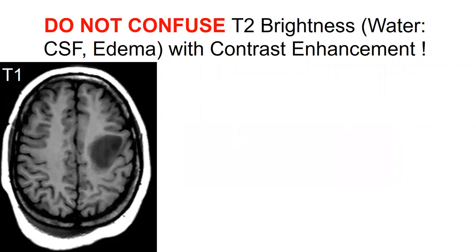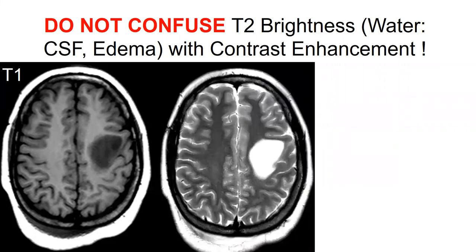All right, look at this T1. There's a lesion. You know it's a T1. How do you know it's a T1? Did I mess it up? The white matter is hyperintense to the overlying cortical ribbon. So yes, it's a T1. All right, question for you on this middle panel. Is the lesion contrast enhancing? What's your answer? Is this an enhancing lesion?